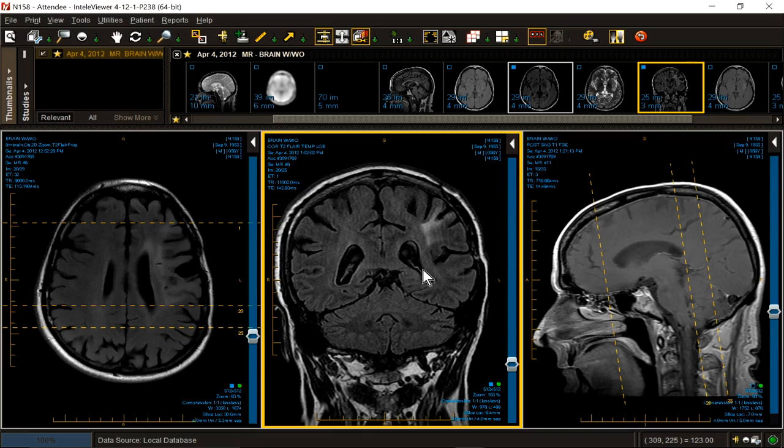Or we could have been wrong for the last 20 years, and it was never an oligodendroglioma, but it was one of the less aggressive subtypes of GBM, simply misclassified. And now we have a way of classifying it properly right from the beginning. In this case, we don't know. But as of right now, oligodendroglioma with nodular enhancement, recurrent residual oligodendroglioma.